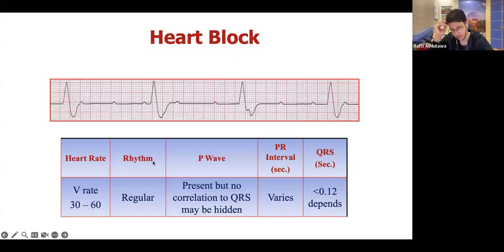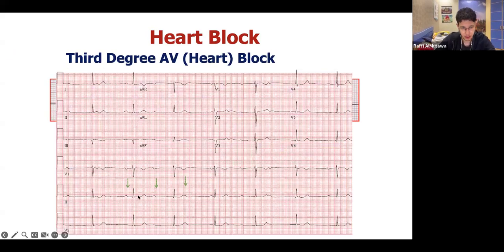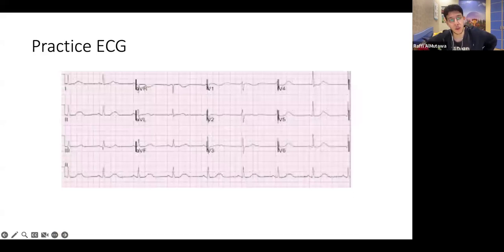And yeah, in the pressure, the JVP stuff, you might see cannon A waves. As you see, the P waves and the QRS are not associated, so there's AV dissociation. That's why I say, remember, the P waves, think of the atria, and the QRS, think of the ventricles. The ventricles and the atria are not associated. Okay, so now we've done every single arrhythmia that you guys are supposed to cover.